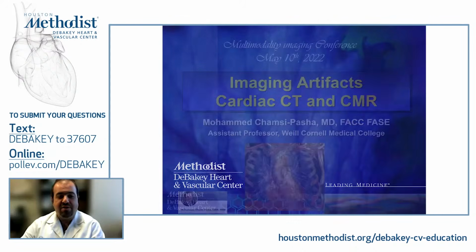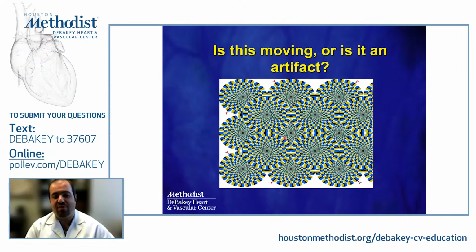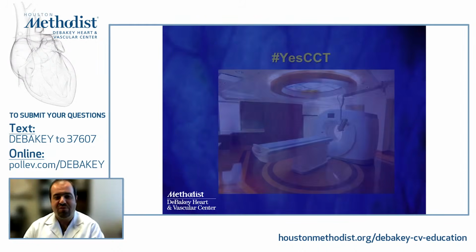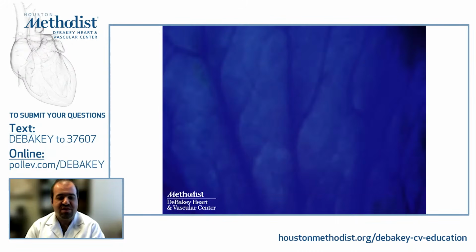When we talk about artifacts, and I hope by now you all have probably seen this cartoon before, are these moving objects, or is this an illusion to the eyes that is making us see those circles moving? The matter of fact is that these are all stationary. And let me start first with the first imaging modality, which is cardiac CT in this presentation.